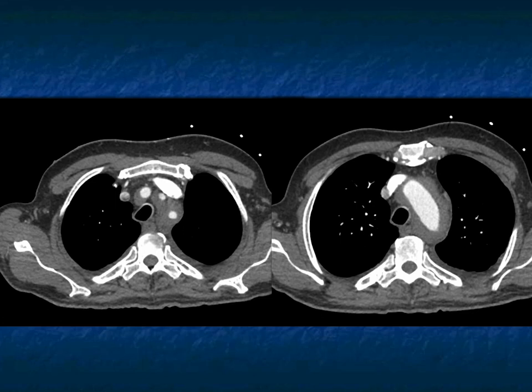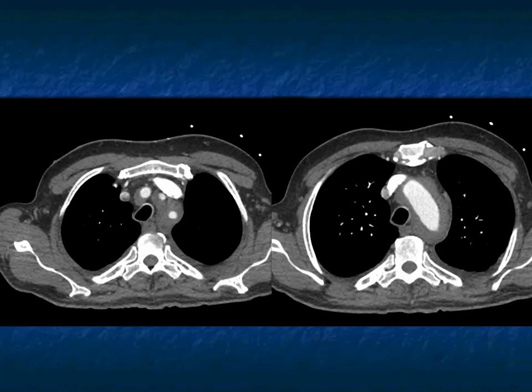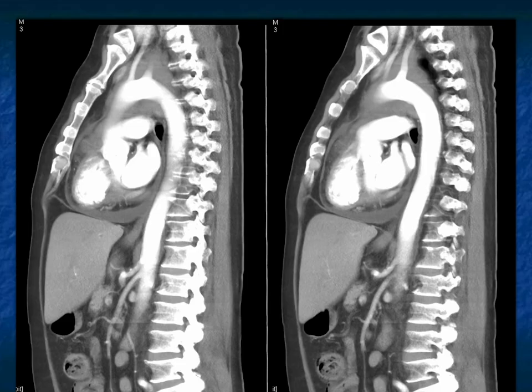Now, of course, I've only given you 2 images. So you're thinking, what could it be? Vascular? Could it be neoplastic? Could it be inflammatory? What am I dealing with? So you got to think some more, and I would love to have more images. You can see when I give you the sagittal views how it extends down the aorta and into the abdomen, and you can see very nicely also the vessel involvement off the arch.